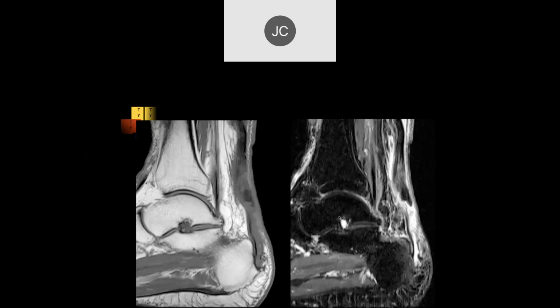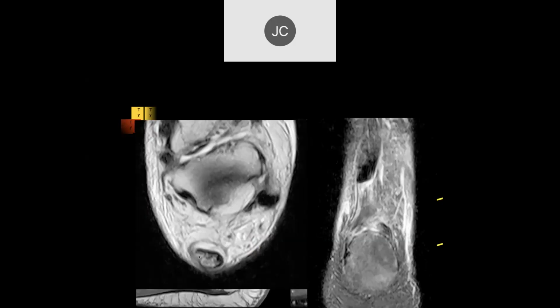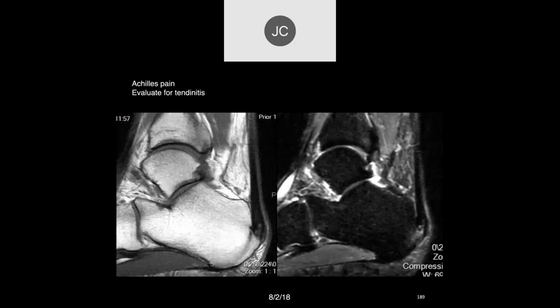Robert, what do you think of this case? Here it looks like that distal Achilles tendon is torn and retracted proximally. Pretty decent tendon gap there. And then here we can probably see a little prominent bony prominence, probably from chronic traction injury and a Haglund deformity before you had the complete rupture. This is probably the plantaris tendon, which may still be intact there. And here, actually, this is probably the plantaris tendon, and then we can see the tear of the Achilles tendon. And this was a distal rupture.